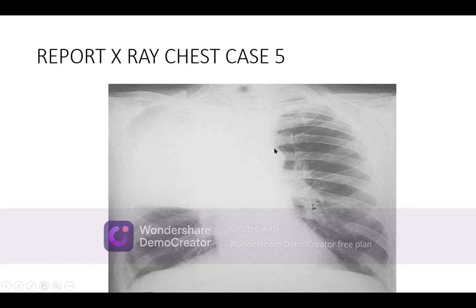You cannot comment except this one, aortic knuckle. So this is called silhouette sign. Silhouette sign means you have blocked some part of the middle mediastinum. So isodense with it. This is called silhouette sign. Either the pulmonary parenchyma is involved or the pleura is involved, which is masking this border. Definitely pleura or pulmonary parenchyma. Silhouette sign is present in this patient.